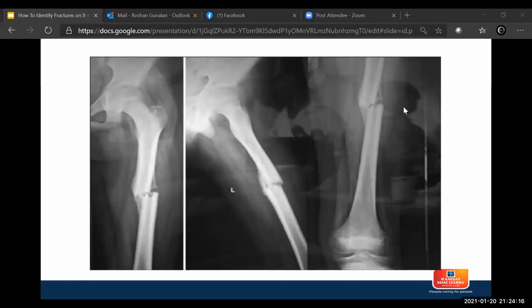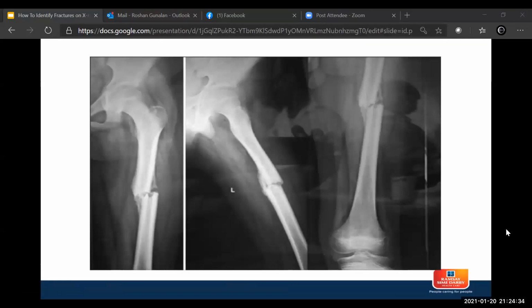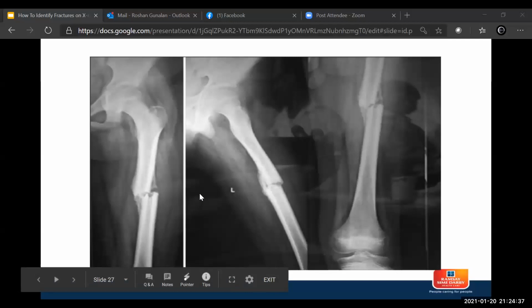And then the presence of soft tissue swelling. You're almost right, except it's not really an open fracture. You can't really diagnose an open fracture on this. Nobody said open fracture. They said comminuted. Comminuted is multiple pieces, many pieces. So this is a little bit vague.